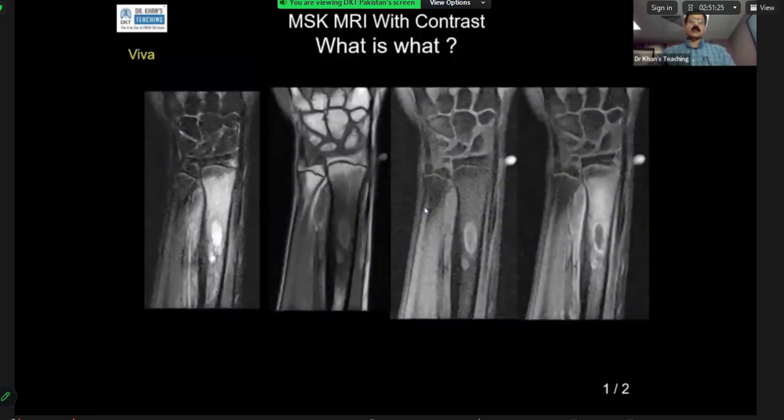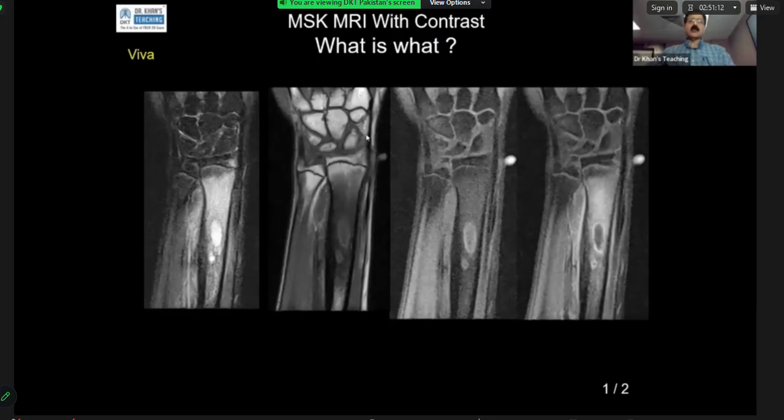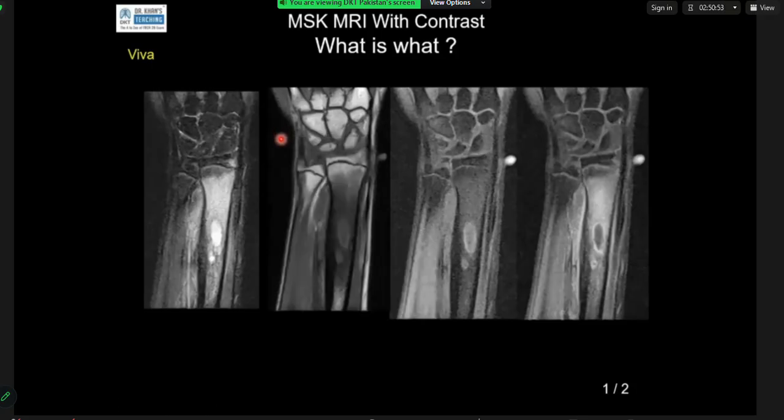Candidate 1. Yes. We have got an MR of the distal forearm. What do you think? Which sequence is this where I'm pointing? Can you see my mouse, please? I can see it now. Yes, sorry. I think this is a T1 sequence. But sorry, there's fat saturation. Yeah, the fat is saturated. I'm going to go with proton density.